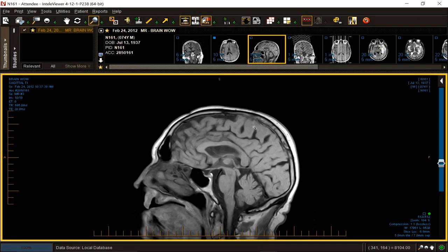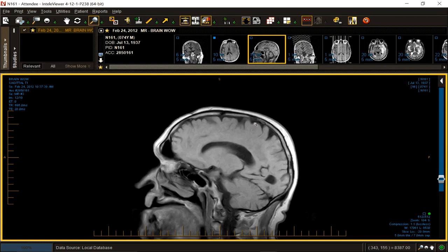I'll start with my midline cut. The history is known GBM. Interval treatment with Avastin. So this is an agent that affects something called VEGF. For you registrars, VEGF, vascular endothelial growth factor, it's something you have to know. So blockage of VEGF by this drug, which was the first classic drug, there are 10 others.